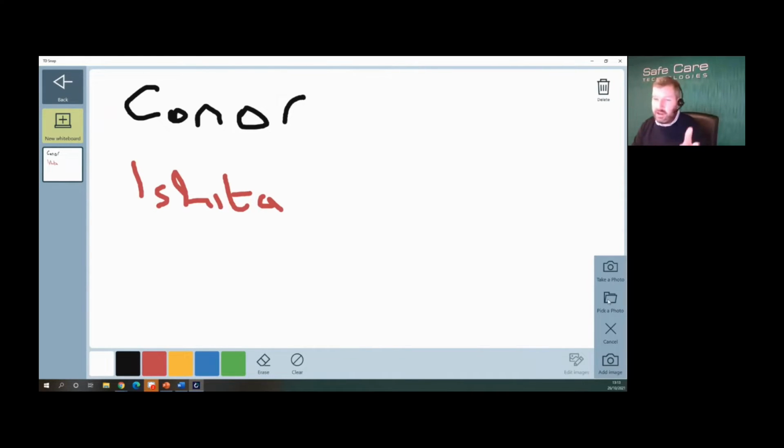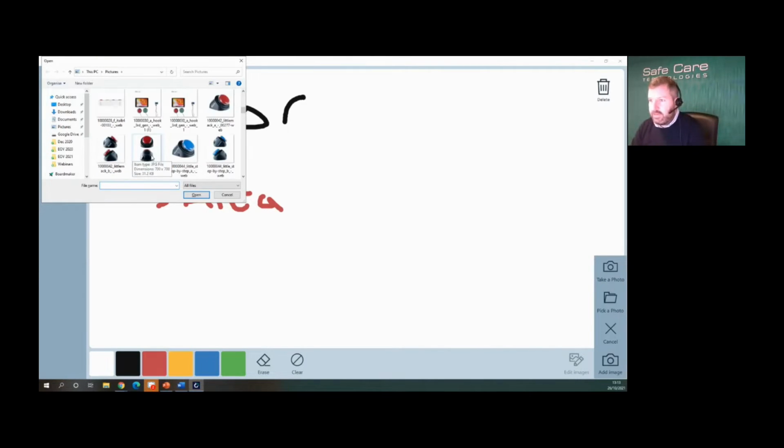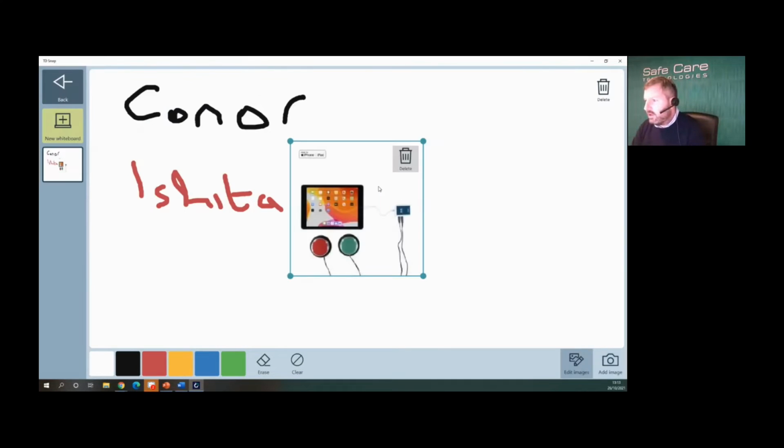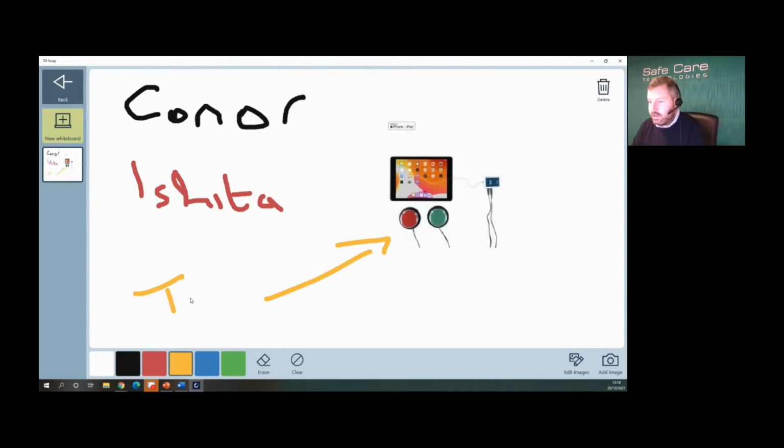You can take a photo. Obviously, I can't because I'm using my camera here for the thing. So let's just say I'll pick a photo here and just say, oh, this is my communication device. This is how I communicate. So I use this to talk, and so on. And you can save these whiteboards.